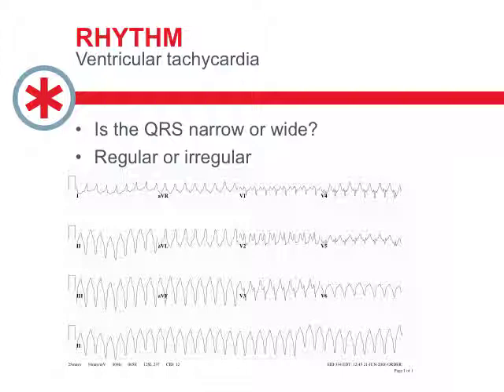Now, there's some ways you can kind of figure out if there's something else going on, and we're going to probably touch on that a bit in the ECG lectures you have. But realistically, if you see something like this, you should be scared. And my motto is, if you see a rhythm that scares you, you scare it back. And of course, we scare it back best with electricity. So if you see something like this, you're unsure, call it ventricular tachycardia and shock it.